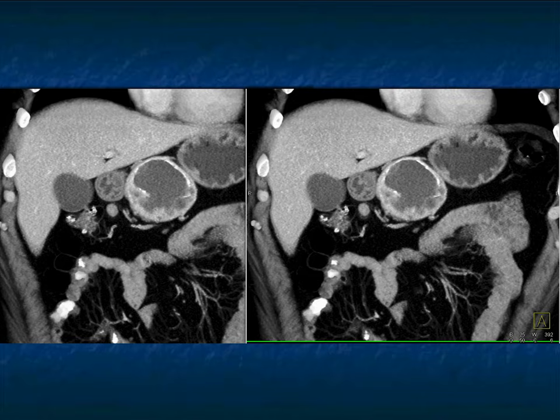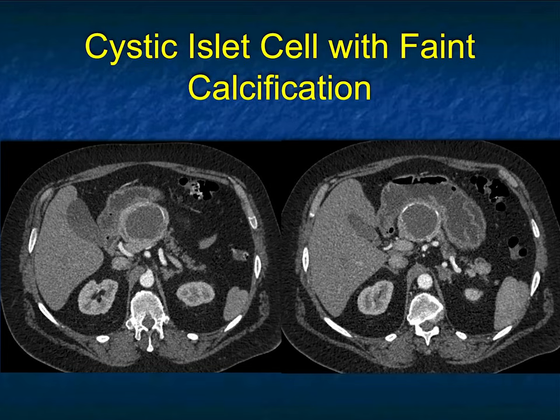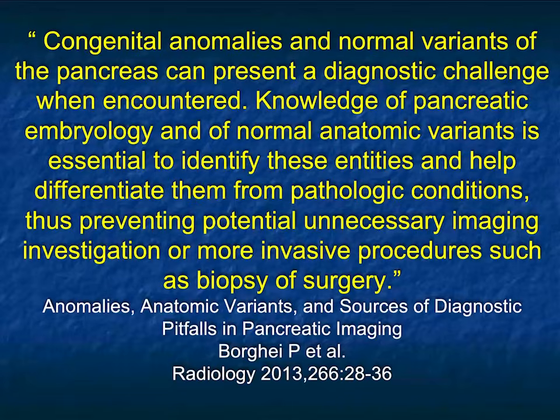And again, here's the 3D volume rendering in that patient, very nicely showing you what ends up being a cystic neuroendocrine tumor. So again, we look at calcifications. Adenocarcinoma does not calcify typically. You can see calcifications if an adenocarcinoma arose in a patient with chronic pancreatitis. When you see calcifications, you think about, based on distribution, neuroendocrine tumors. You might think about a serous cystadenoma, particularly with central stellate calcifications. You could talk about MCNs with peripheral calcifications, or SPEN tumors, which can have dystrophic calcifications as well.